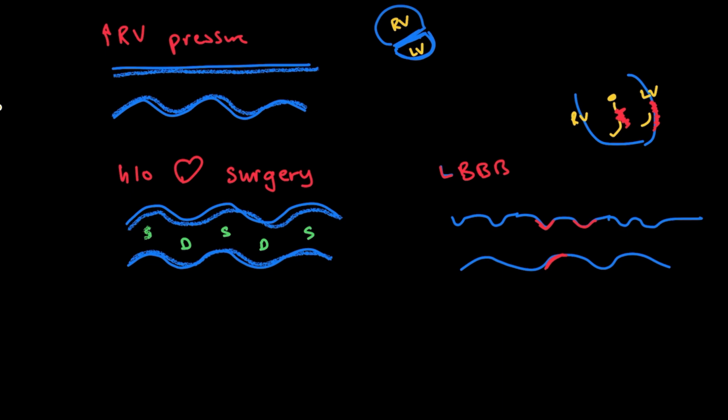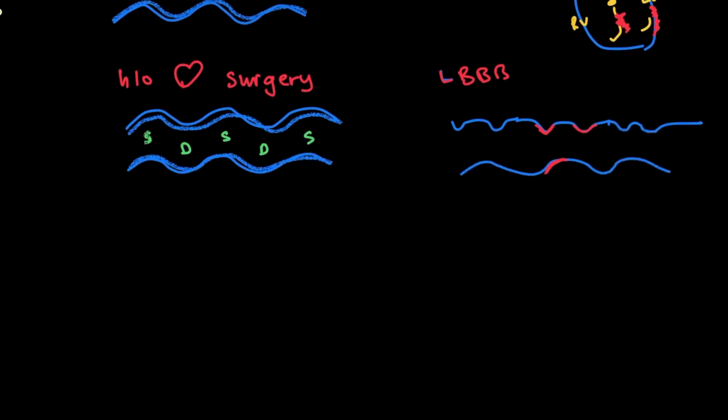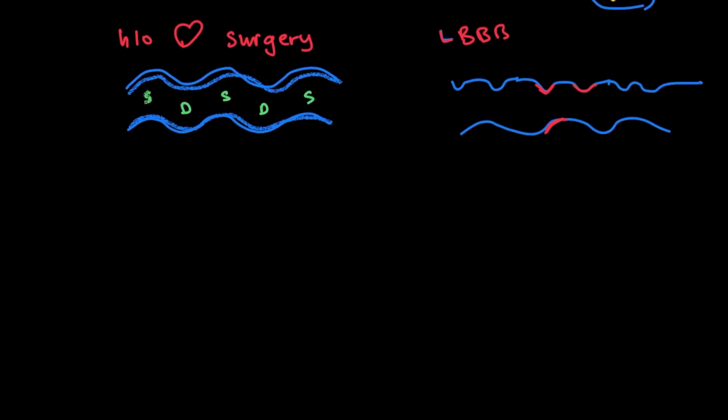And then one last one that I'll mention. For this, I'm going to include the mitral valve as well. So technically this is a slightly different M mode slice, but it's still related to the ventricle. So this is if we have a decreased ejection fraction, you'll see something like this.